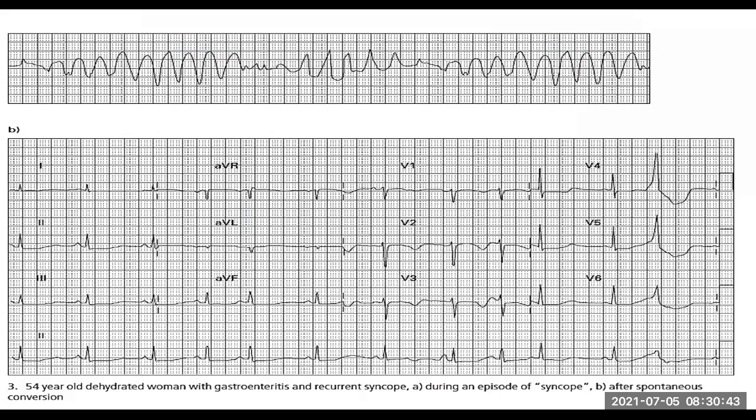Yeah, they do look relatively normal. They're changing a little bit. Well, the spacing we'll get to just now, but in terms of how they look, we can see there's an occasional change in them, but generally overall they look all right.